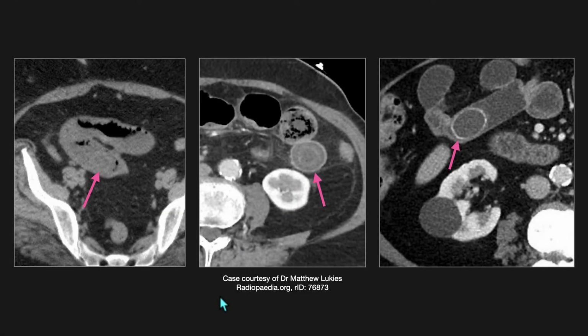It is important to recognize the varying appearance of the obstructive gallstone in cases of gallstone ileus. And while in our first case we benefited from a partially calcified wall, oftentimes the gallstone can blend in with the enteric contents, causing a diagnostic dilemma and delayed diagnoses. Other times you may see a lamellated appearance like this. So keep in mind that it may be isodense with the enteric contents, lamellated, or partially or completely calcified when potentially evaluating this cause of obstruction.